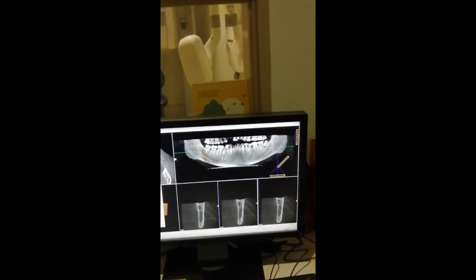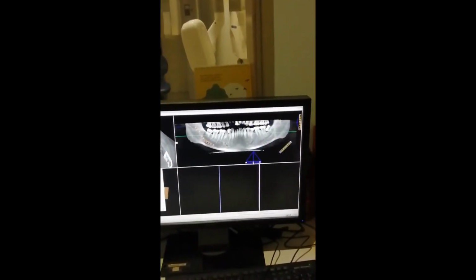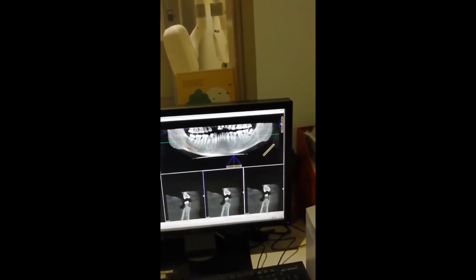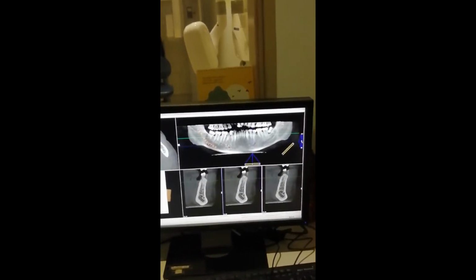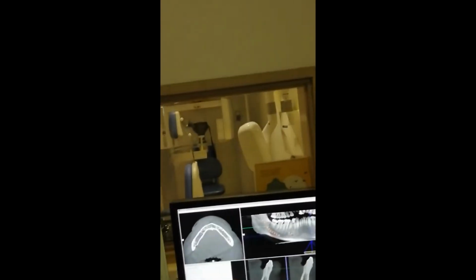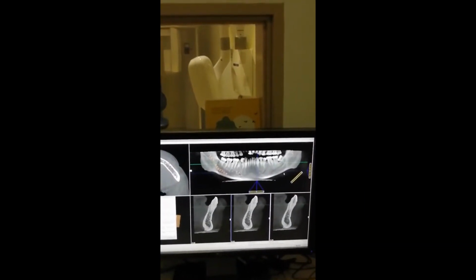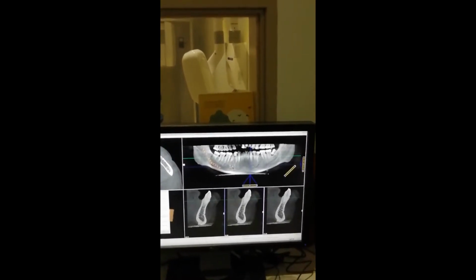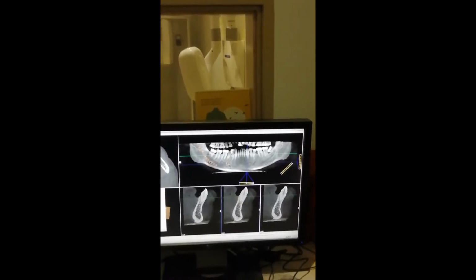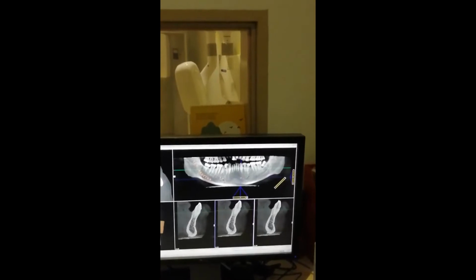Yeah, this is the entry point, right? Now exit point elevation. To draw it, pull it down, otherwise mandible is not seen. Okay. I missed it. Oh, right. Yeah, very small, huh? Very small exit actually. See? Let me check.